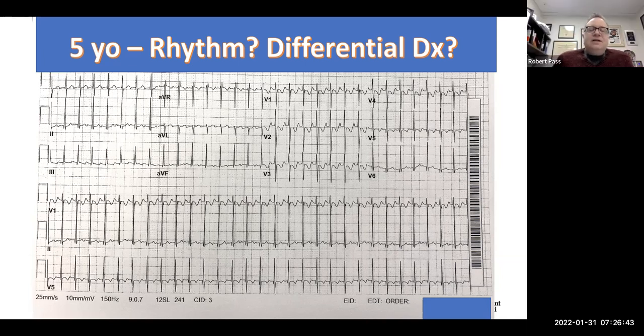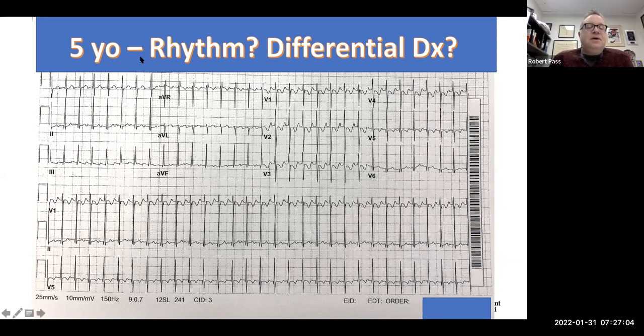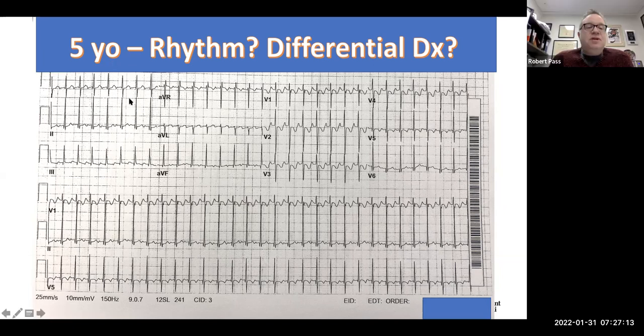Okay, so that certainly is a very good potential diagnosis here. That it is EAT. Is there anything else that this could be? It could be like a long RP interval, so it could be ORT. Okay, now what is the RP interval normally in ORT? More than 70 milliseconds. Okay, so what would this RP roughly be in this case?